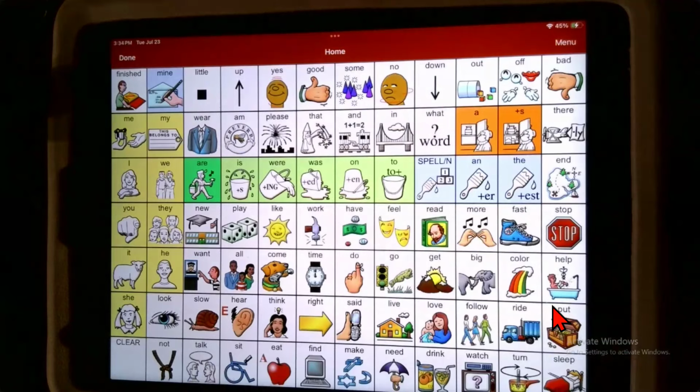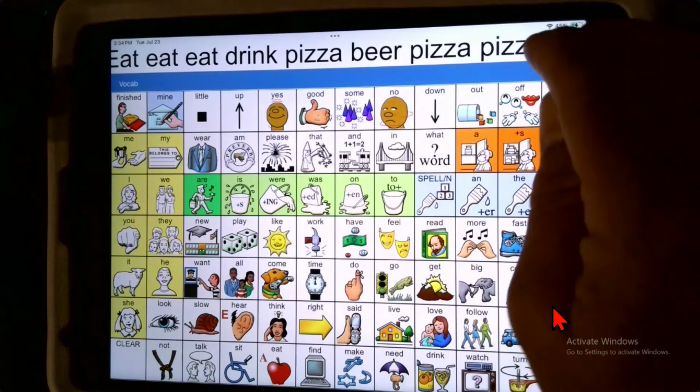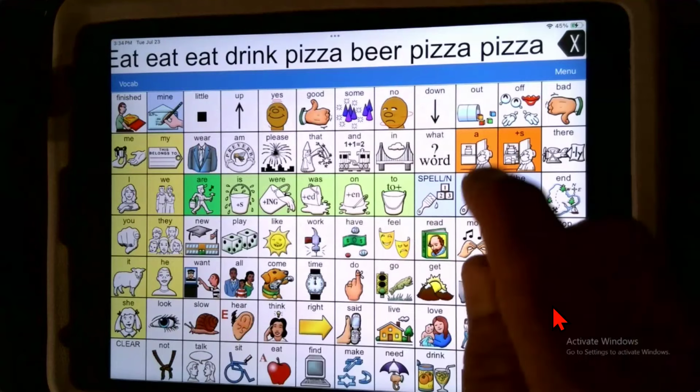All right, so I guess kind of going back to the old trick we taught you a little bit ago. Okay, so we've learned how to use word finder. We've learned how to use vocabulary builder. We've learned how to color code a key. We learned how to hide keys to make them invisible, or now to get them back.